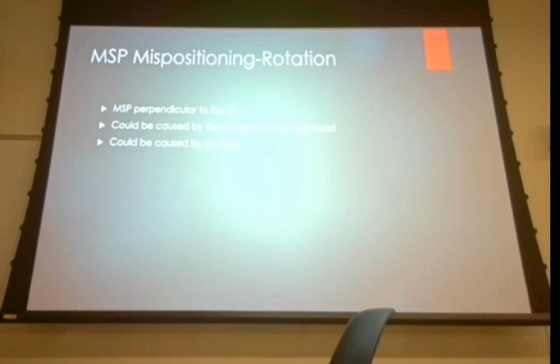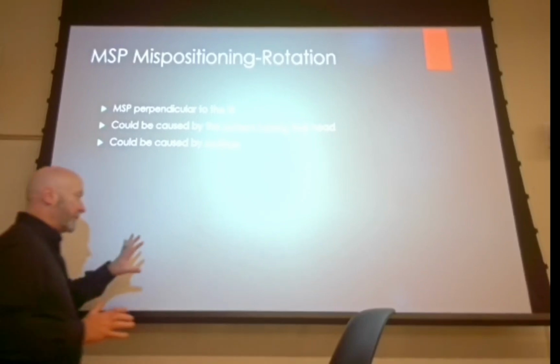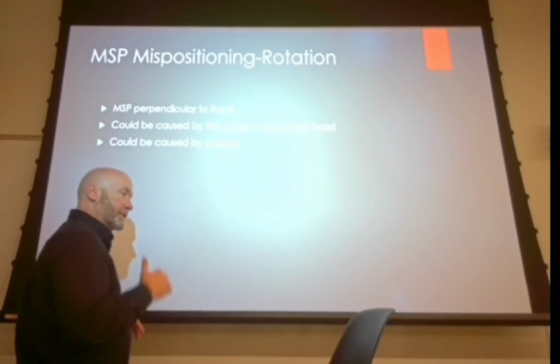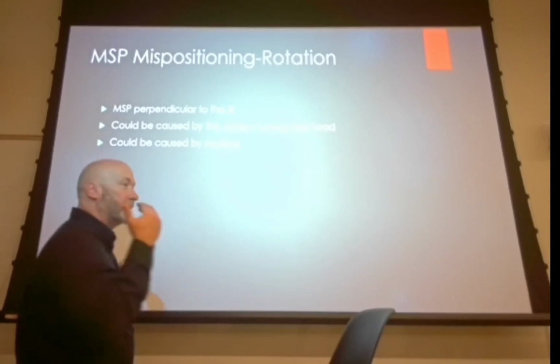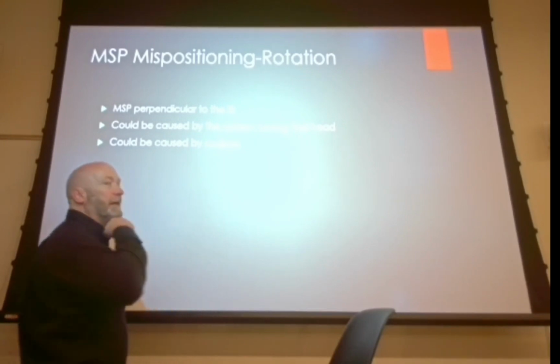All right, so in rotation, our mid-sagittal plane is not perpendicular. It's some degree of an oblique, and it can be caused by turning of the head. So you get the patient up to the wall bucky. You say, I want you to put your chest up against the wall bucky. And maybe they're a small patient with a short neck, and they get up against it, and they can't get their chin up in that cup, and they turn their head just a little bit.